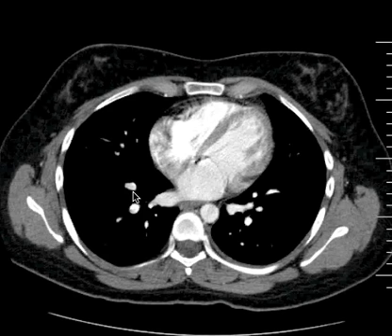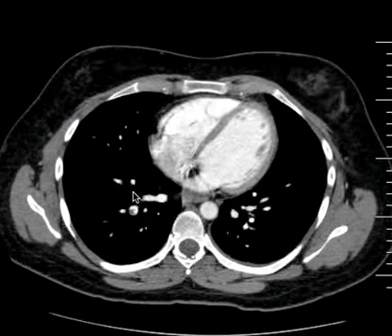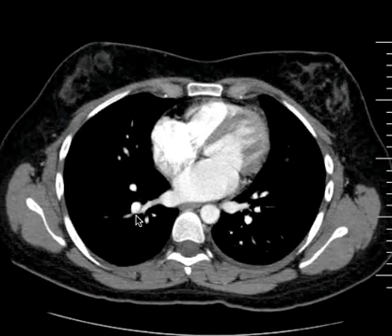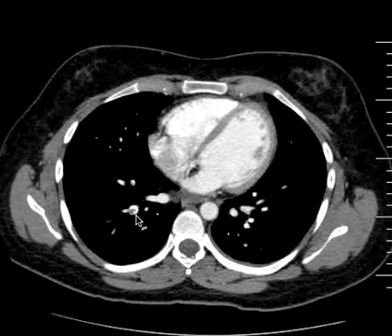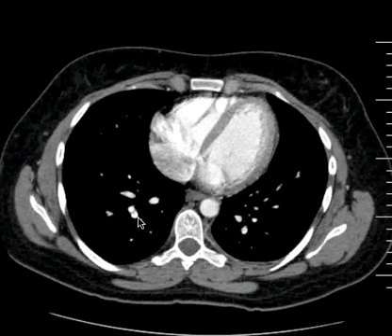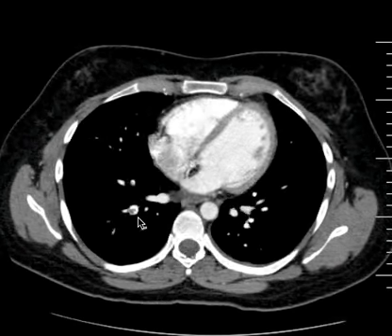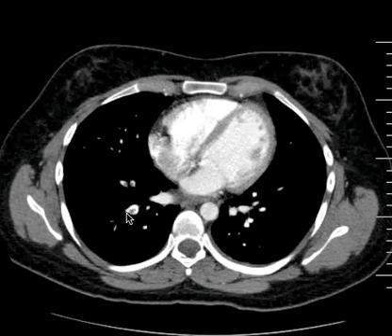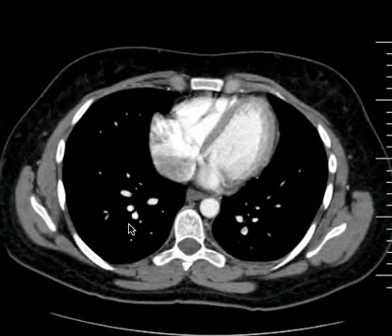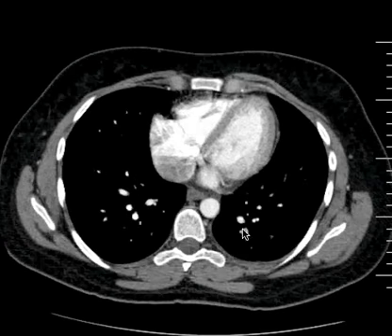Right there, you can see it lodged right at the branch point and extending into the two little branches, just hanging over that little division. And there's one here too. You see that? And if we go up, and then I'll go back down, there you see that. Right, probably lodged right at that level. Actually, it looks like it got hung up right where this little vessel is coming off. You can see it extending just a tiny bit into that. And so that's another clot. And, oh, look over here, we've got another one there too.